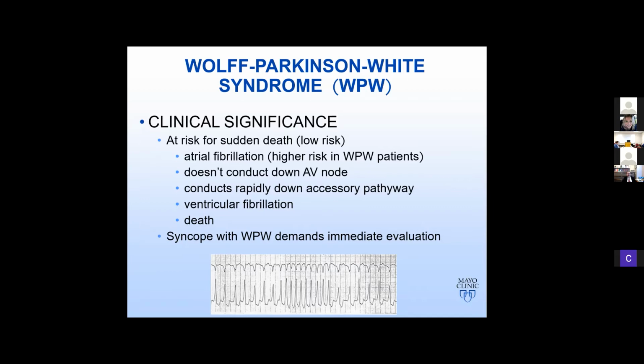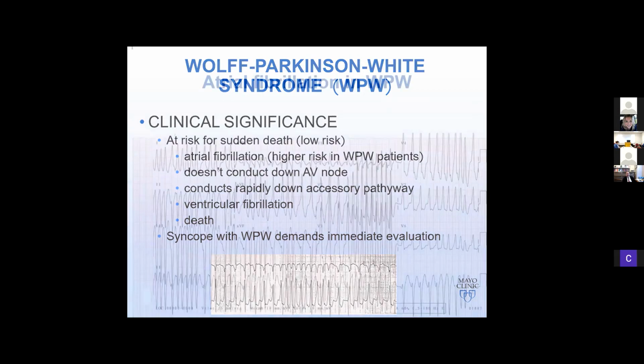So if you have a patient who has syncope, the overwhelming majority of syncope in pediatrics is benign, but if you notice that there's WPW in syncope, that demands an immediate evaluation because that patient may have actually had an aborted sudden cardiac death rather than an episode of just garden variety syncope.